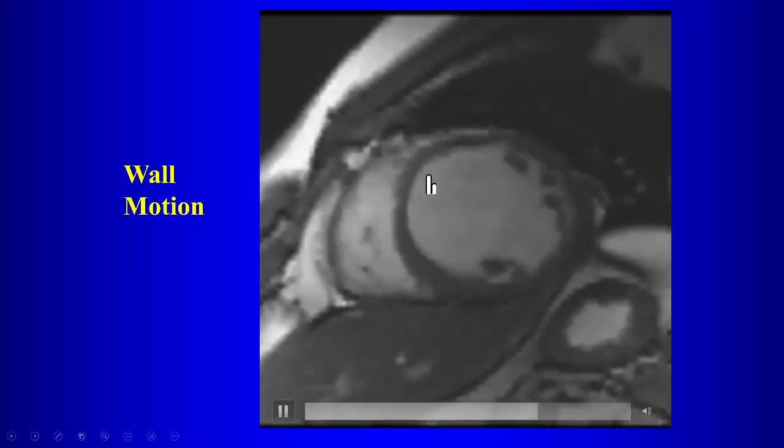So I think the anterior wall of the left ventricle isn't moving as much. Right, so the anterior wall here, and also this area, which is the interventricular septum. That's not moving as well as you would like.